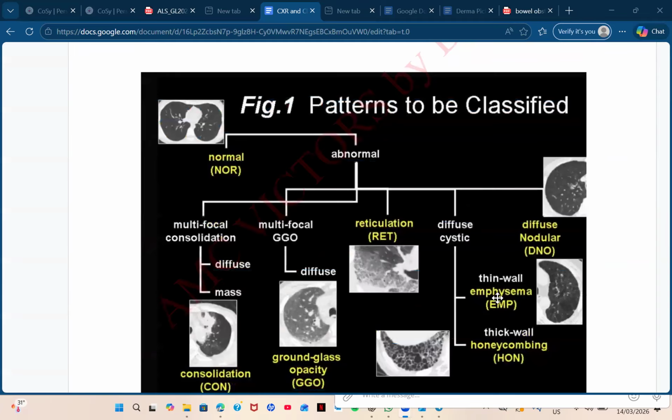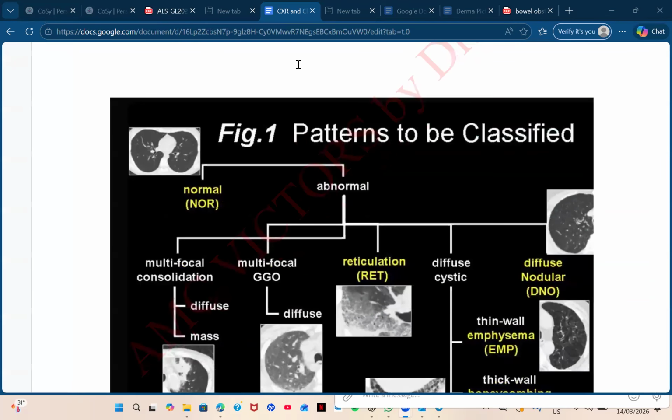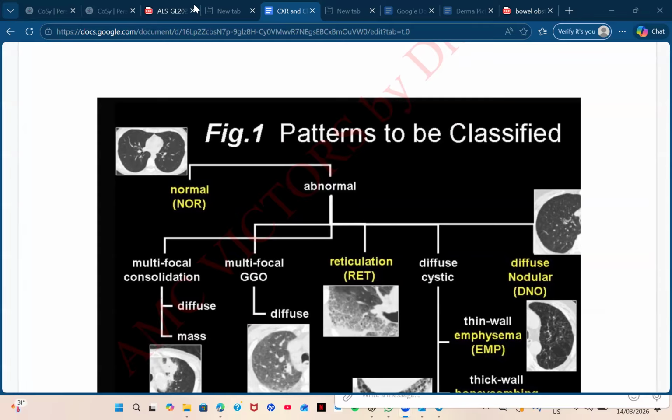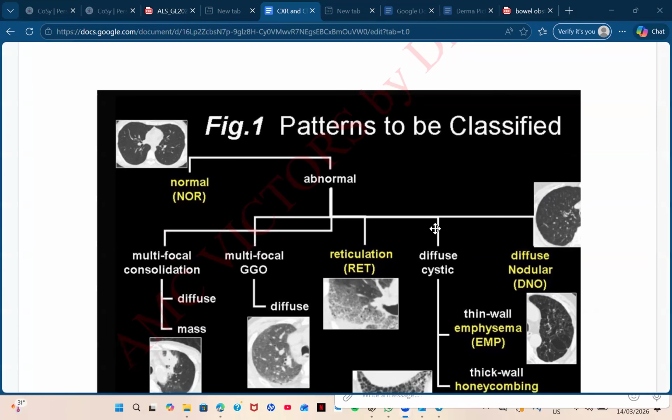So what do you know about chest CT in these fibrotic diseases? What are the appearances that we can see in chest CT? In CT we have two main things, right? We have honeycomb appearance and what else? Yes, honeycomb appearance, and we have ground glass opacity. Now tell me where we can see this honeycomb appearance.